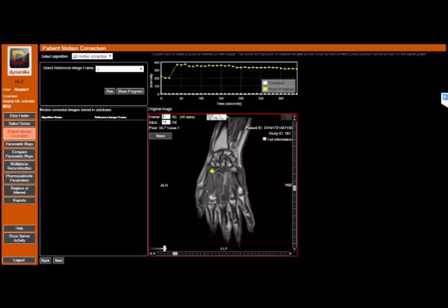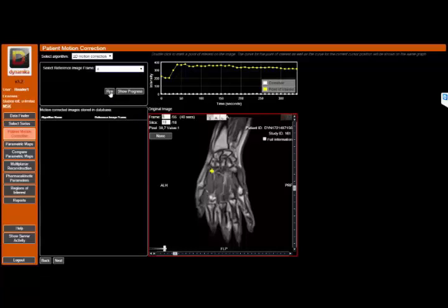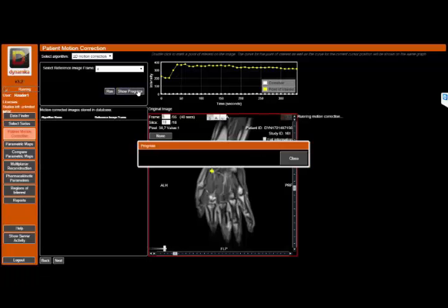You can also choose any other frame, but we have discovered that having a little bit of contrast in the images when you do the registration will ensure a very robust and reproducible registration. So in this case, we choose frame number 4. And then we say run. You have the possibility here to show the progress as it runs, on your left.